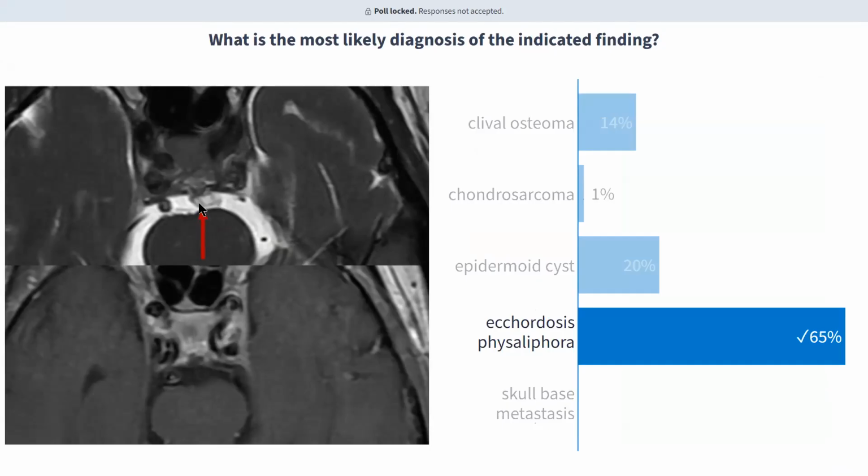It's associated sometimes with a projection of bone at the stalk of this lesion, which is difficult to see on MRI, but sometimes there's also a corresponding divot into the clivus as well. And so you don't have this normal marrow enhancement in this little divot associated with this abnormality. So, in the differential would be chordoma.